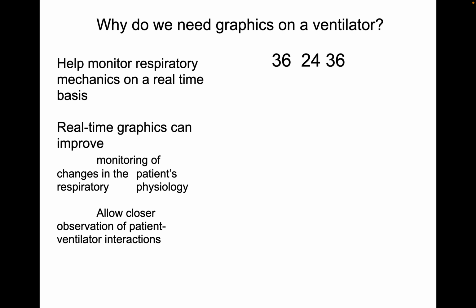So this is the classical flow versus time, the first scalar. The second is volume versus time, and this is the pressure versus time. So this is how the standard scalars look. On the y-axis you have the variables in the form of flow, volume and pressure, and on the x-axis you have time, and this is the appearance of the standard scalars.